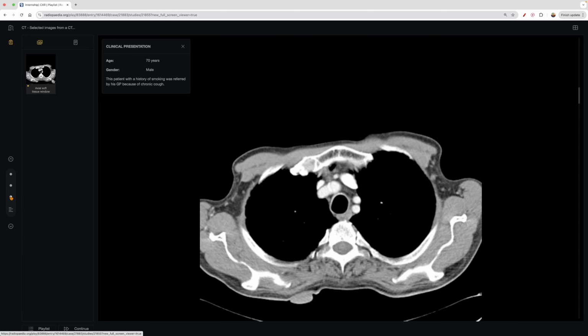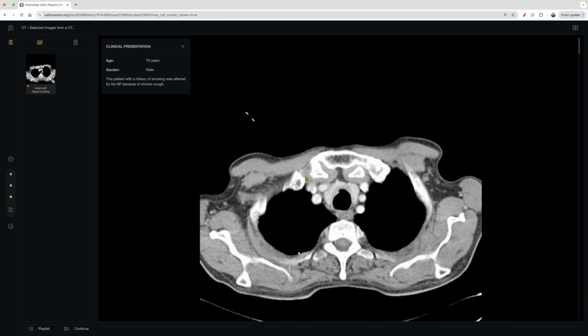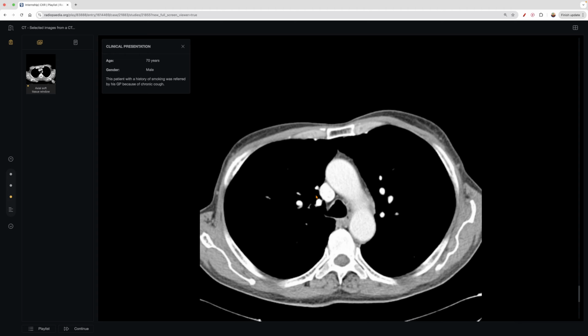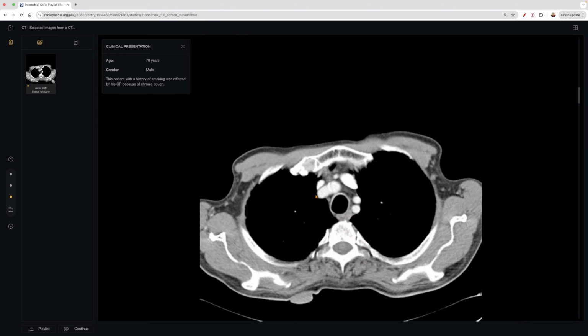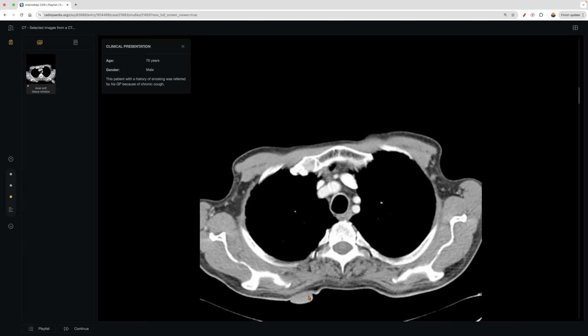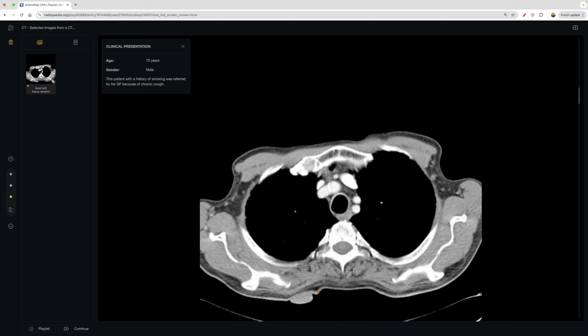However, this patient was referred to a cancer center for suspected lung cancer. So let's scroll down. This isn't really a window for the lung tissue, but let's see if there's anything that strikes out to us, and there's not. What's interesting is that what we were seeing here, remember, we saw this in the right upper lobe for sure, was actually something posterior, a lesion under the back. I think it was probably a lipoma, super common. Extrapulmonary location.